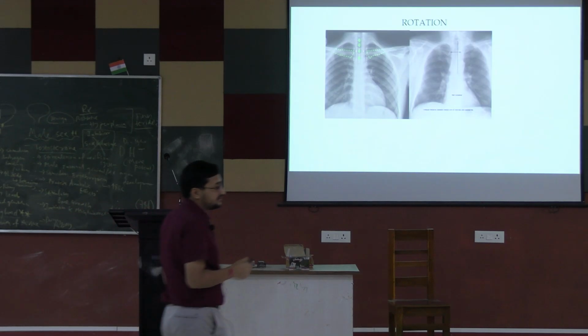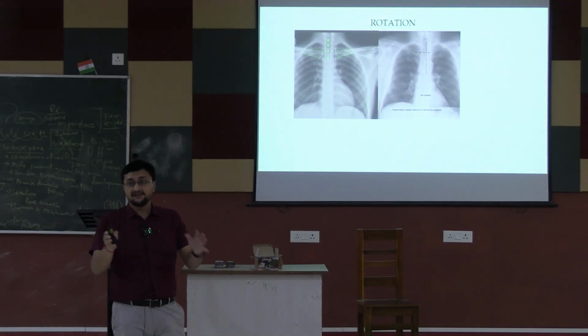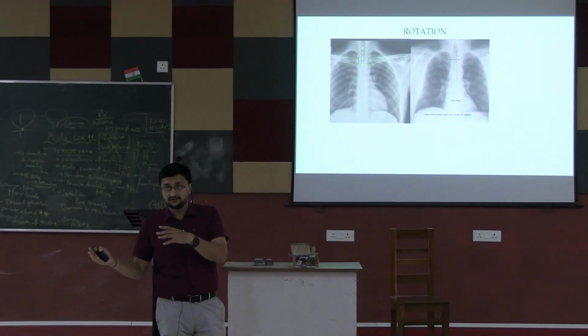And next one is rotation. Whether the patient position is correct or the patient is rotated, right?